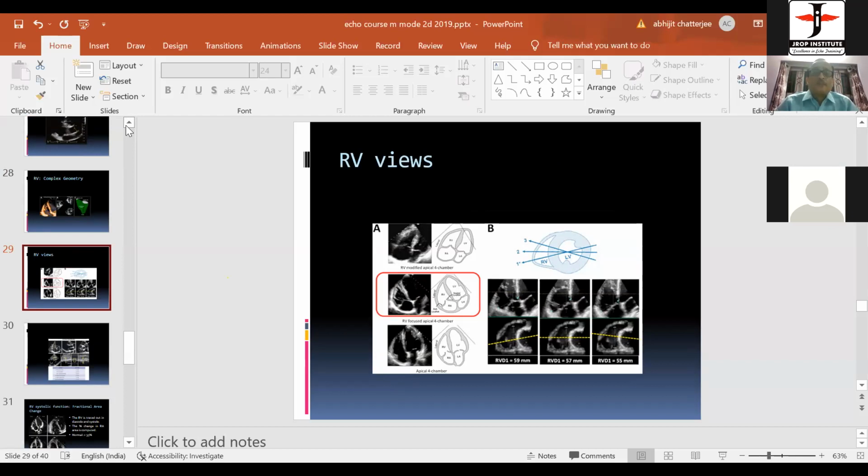You must take repeated measurements. Remember that the mitral annulus is not a circular structure, so it is better to give it in the 4-chamber and 2-chamber view so that the surgeon may have a better idea. The other important thing is that if you want to measure the aortic annulus, then I've just shown you, from trailing edge to leading edge. The picture that I was showing, that was the aortic annulus.